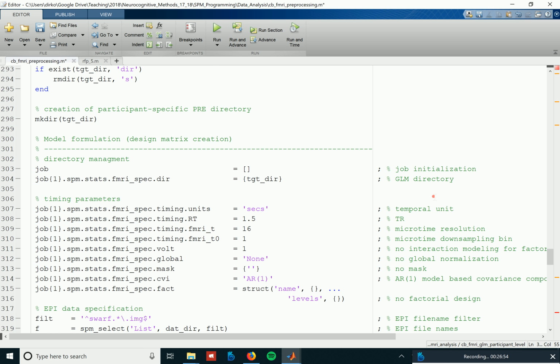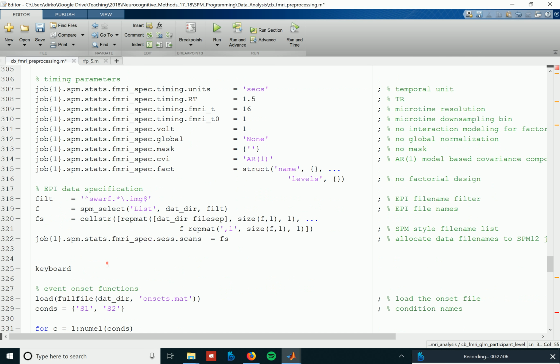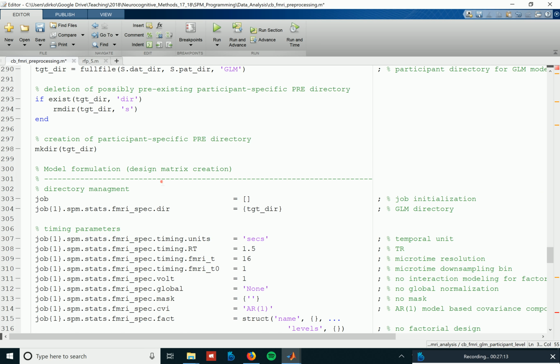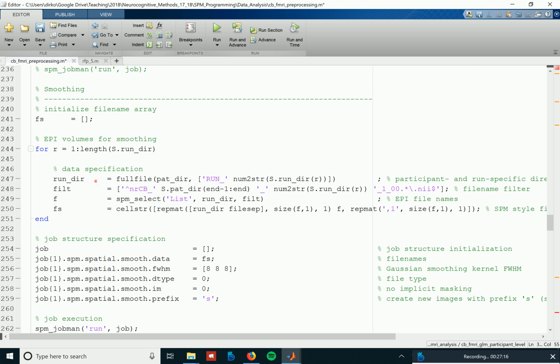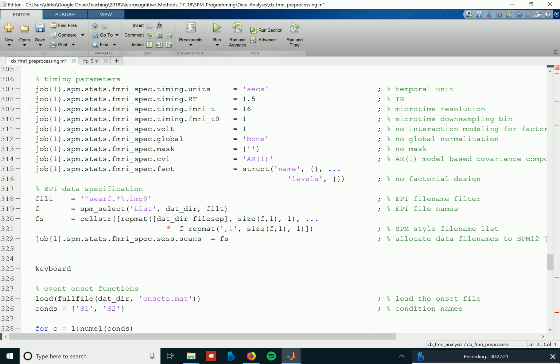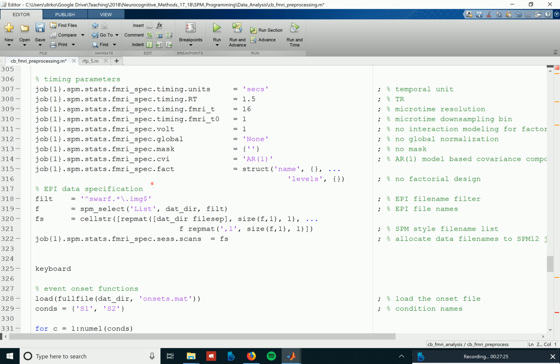Put it in there. Good, and here we need to now adapt it to what we have right now. Wait, here we have to actually be much more careful, because here I had everything for just one run in one folder, but here we now need to specify the scenario that we actually have multiple sessions. So we have to basically continue where we left off with the pre-processing.